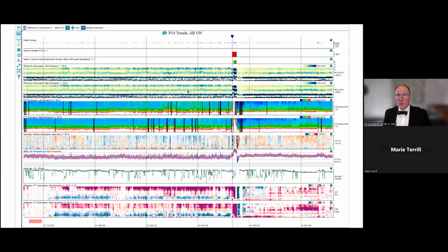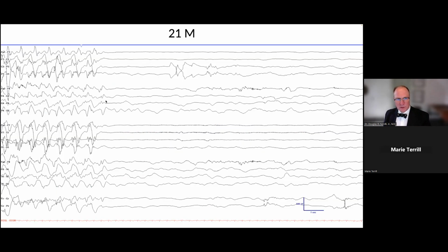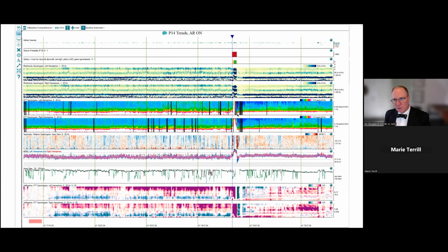All right, so we look at the panel here. We've identified it. It's no difficulty. Persyst shows the seizure probability is very high. And you go through the same trend analysis and you can see not only the activity that has started on the right, but evidence here of bilateral involvement, just as we saw in the EEG. Note also, you probably observed, I didn't comment, that there's an abruptly attenuated termination pattern here, or PGES, that's occurring. And you can actually see that both on the dip in the fast Fourier transform and also in the amplitude integrated EEG, that the bottom just drops out.